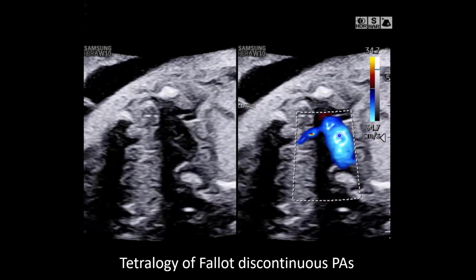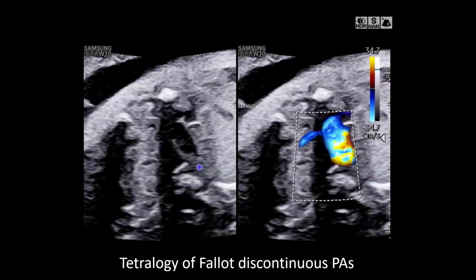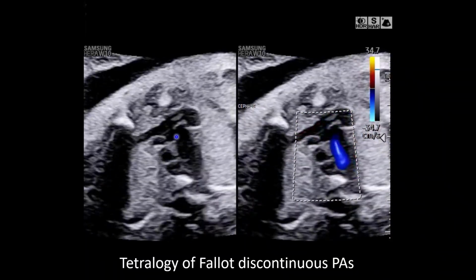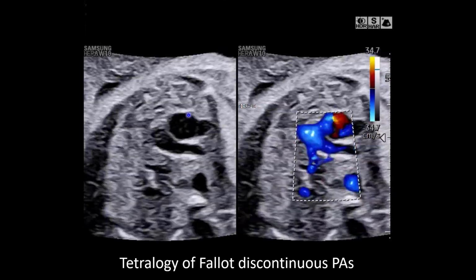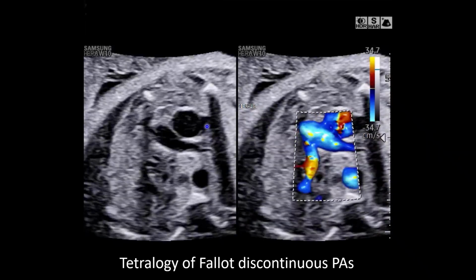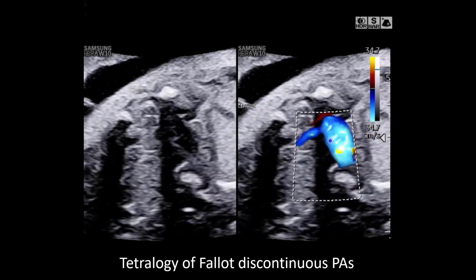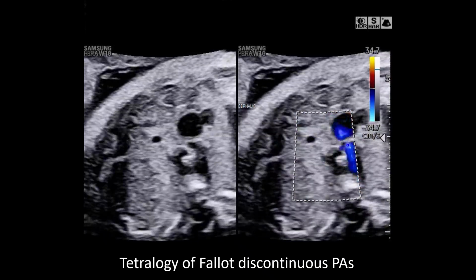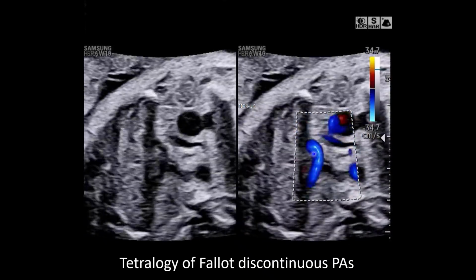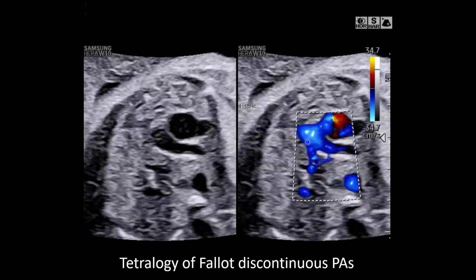We're seeing that it is a right-sided aortic arch. If you keep your eye on the trachea here, right-sided aortic arch. At the end of that, you're seeing the main pulmonary artery and the RPA. There's the innominate vein draining into the SVC. So we have a good picture of what's going on in the upper chest. And you're seeing antegrade flow in this color Doppler picture through the MPA and RPA. And the LPA here, you're starting to see is at a slightly odd angle. And then there's this little bit of a flicker here.